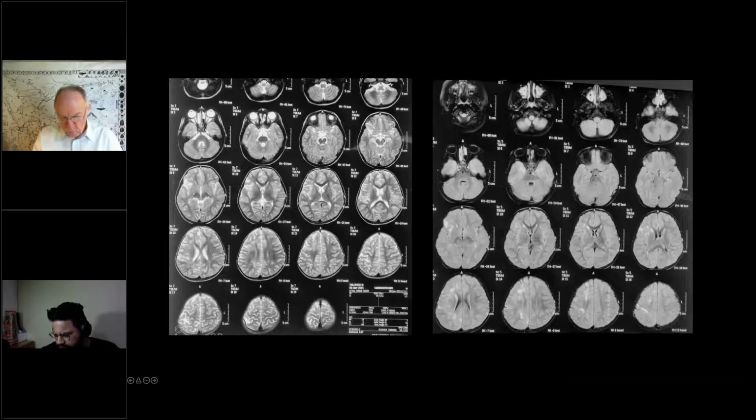I don't think this is a cortical dysplasia, if that is the question, Dr. Ramesh. It looks like more of a normal signal change. It's scarring, and it's mostly right hemisphere, isn't it? Yeah. I think the line on the left hemisphere is actually an artifact on one of the sequences. And I think the twin transfusion theory works for this, even though it is unilateral. And infection would be unusual to be on one side only. So this, but not a cortical dysplasia for sure.